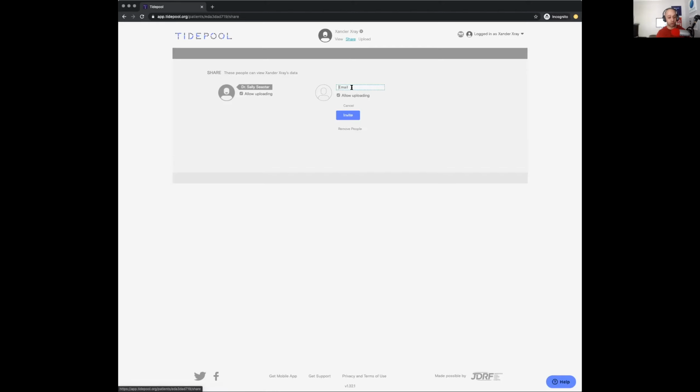So what you can actually do is when you go to this share interface, click share, put in an email address. We'll just put in my email address, which is christopher@tidepool.org. Now you all know who I am. You can send me an email if you have any other questions about this stuff. But you put in the email address associated with their Tidepool account and you click invite. And then an invitation is sent by the Tidepool system to your CDE, to your endo, to your cat, to whoever, to actually accept that invitation to view data on their end. Once they accept that invitation, then they're able to log into their own Tidepool account and view your data.